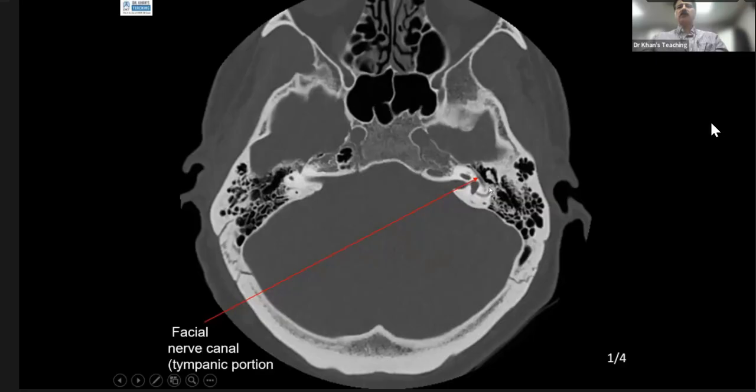What is this? Candidate one? Yes, if that's the tympanic part, so... No. Sorry, this one is the tympanic part. There is something else which is just superior to this level. Of course, on an axial slice, you are seeing a bit of partial voluming here.